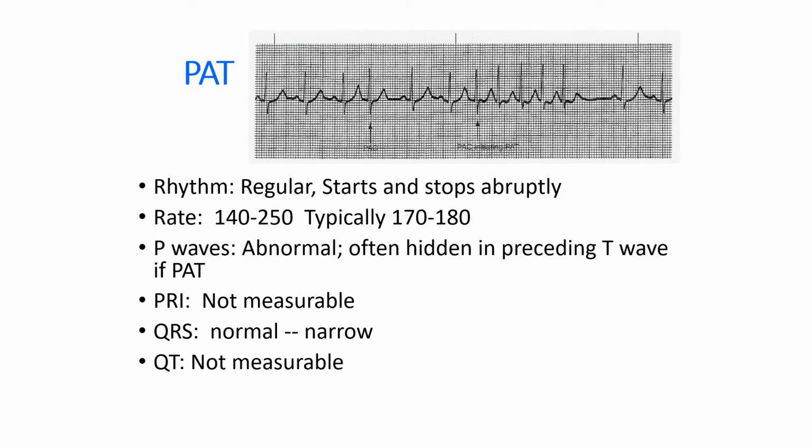In PAT, paroxysmal atrial tachycardia, in this figure you can see that there's PACs on the fourth complex. You have a sinus beat, then you have a run of PAT or PSVT. So more than 3 PACs is going to be considered a run of PAT.